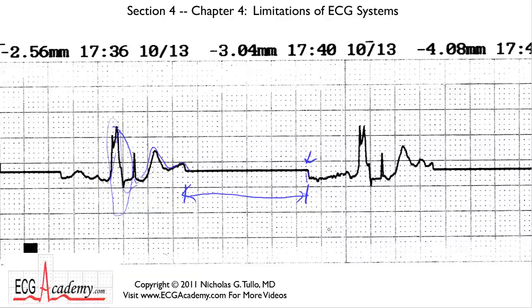That's almost like where the wire makes a connection, and the real electrical signal suddenly appears to the circuits of the ECG machine. So you'll see this sudden drop. It could go up or it could go down. When you suddenly make the connection, the circuit will be closed, and then you'll record this usual baseline artifact, this little tiny squiggle here. And then there may be some noise in this, so this doesn't look like a good signal. But from here to here, again, you see someone took a ruler and drew it. And this is a kind of make and break artifact.